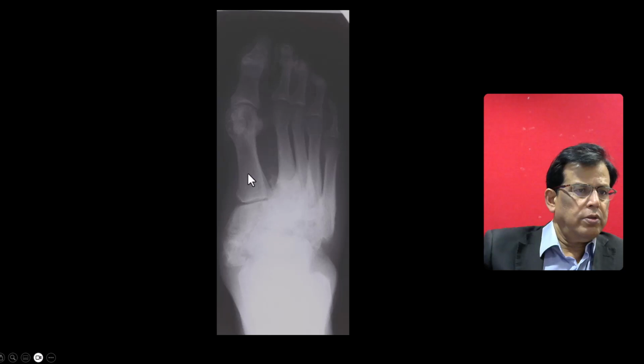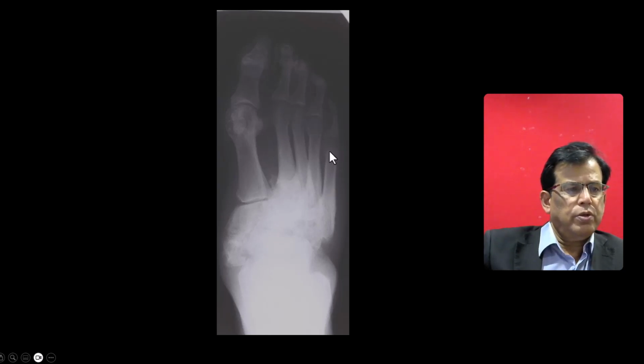I'm trying to look for vessel wall calcification. You don't see it. I don't know. Okay. And if there is ulceration in this and you are worrying about infection, what do you do? Also in the foot, it could be osteomyelitis. How do you investigate?